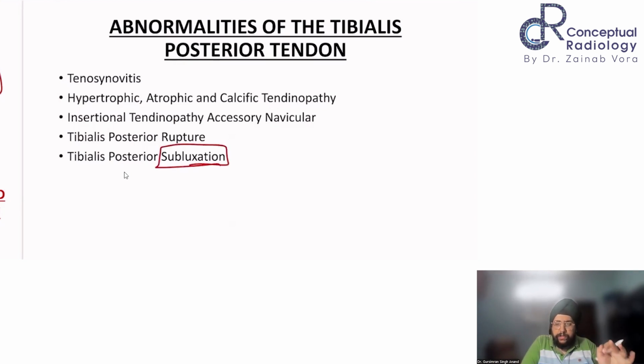You have to always check. One is your tibialis posterior and one is your peroneus brevis.